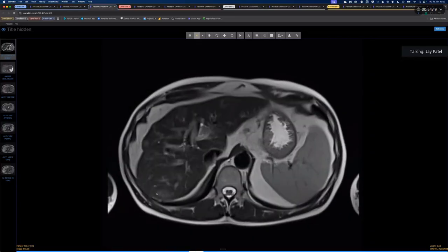So atypical FNH, to reiterate, the intentionality is not to get the diagnosis right. It's a difficult diagnosis. The intentionality is to talk me through a liver MR, a systematic approach of thinking about things, understanding the different contrasts in terms of Primavist and extracellular and phase of contrast.